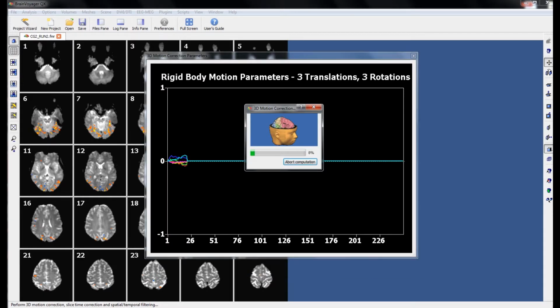As a passing comment on 3D motion correction, it's always advisable to recruit subjects who are capable of staying still inside the scanner. Data collected from subjects who have moved more than we would like inside the scanner lead to problems with 3D motion correction, which causes problems with co-registration. Motion artifacts become much more of a problem at higher resolutions, so it is advisable to recruit subjects who have a good track record with MRI.